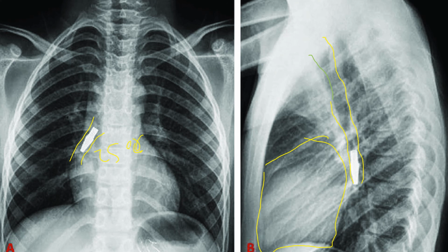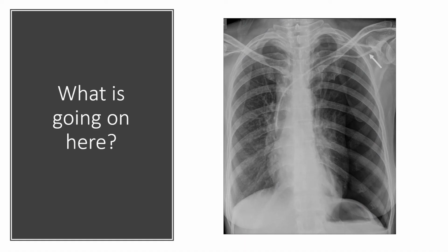So what type of bronchoscope would you think they would use for this? Hopefully you said rigid. All right, what is going on here?